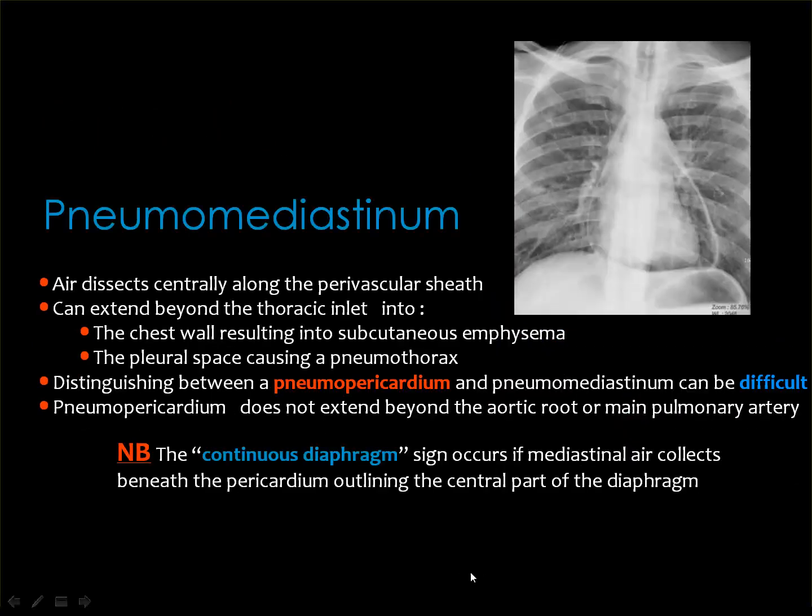And these are sometimes, they said in the literature, it may be difficult to differentiate between pneumopericardium and pneumomediastinum using the chest X-ray. But I think that one of the helpful signs for pneumomediastinum is the presence of air at the root of the neck.